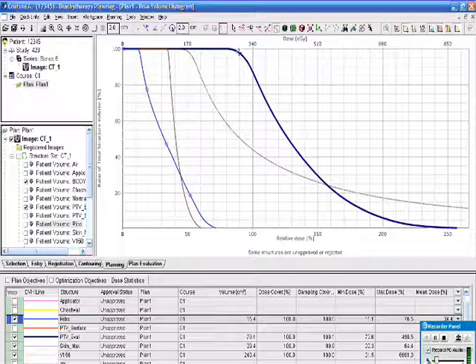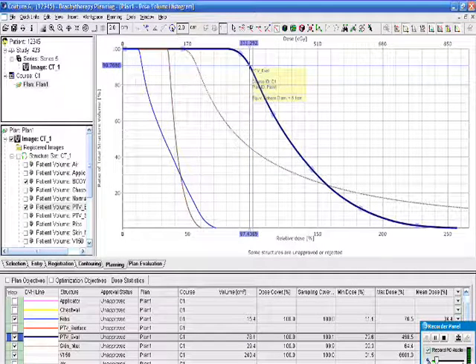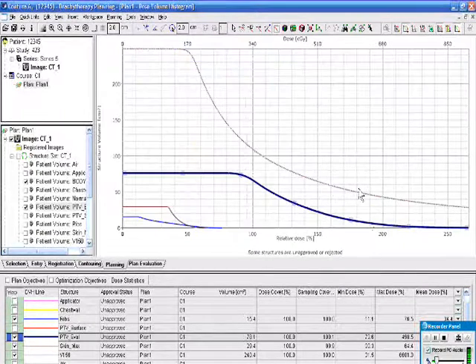Now, let's have a look here. We're at 89% dose. We need to be 95% dose, so let's, there we go. Okay, we're about 95% dose here, and we have 93% coverage of that. So we would like to have just a little bit more than that. We would like to have this at 95%, but we know that we're close there. If we want to look at the V150 and V200, those are in absolute, so we'll change this to absolute volume here for those, and turn my crosshair back on.